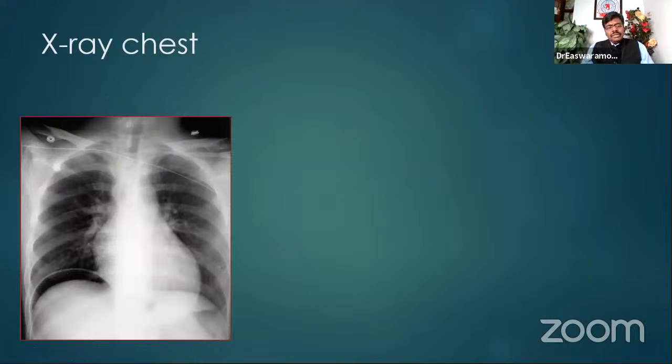Here is a 40-year-old patient who came to the emergency two days ago with severe abdominal pain. He was in hypotensive shock, was resuscitated, then subsequently taken to theater and operated. And this is an X-ray we had pre-operatively, just before he went to the theater. This X-ray is a chest X-ray, as you know. That is the background information. I asked Bharat whether he could see what you can read, or a diagnosis, Bharat.